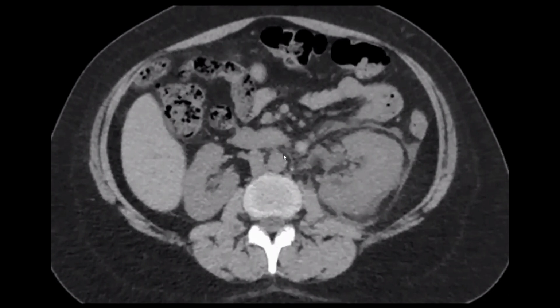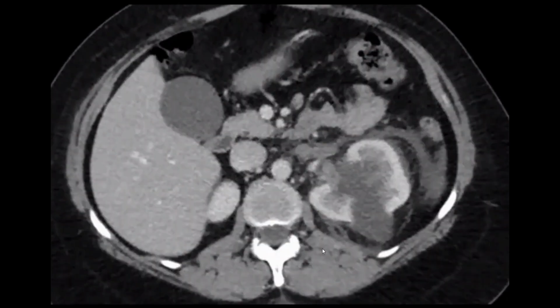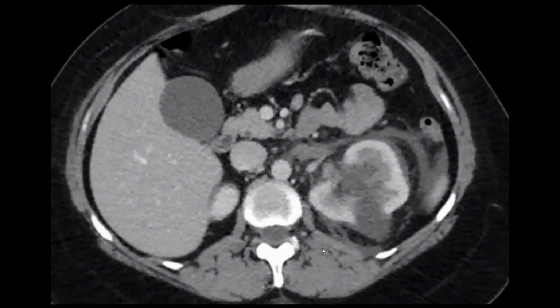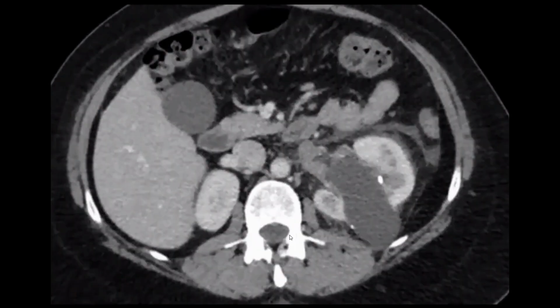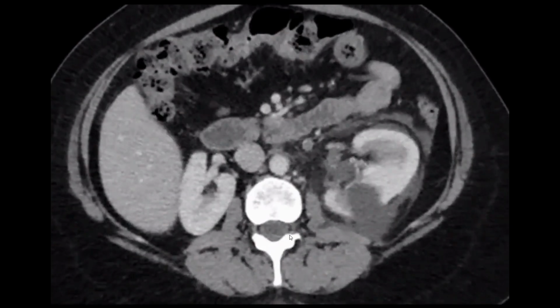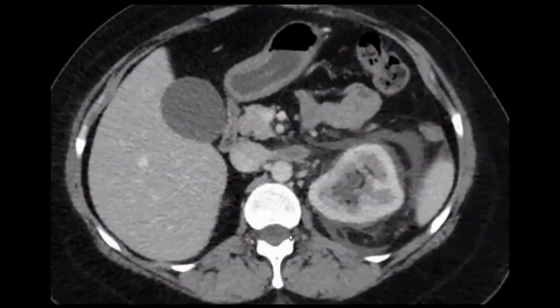Okay, can we move to the contrast enhanced study? Yes, sir. On the contrast enhancement, I could appreciate that there's a mass in the left kidney, and there is an extension. I think there is thrombus within the branches of the left renal vein, and in the gonadal vein as well, reaching up to the IVC. No thrombus in the IVC is perfect.